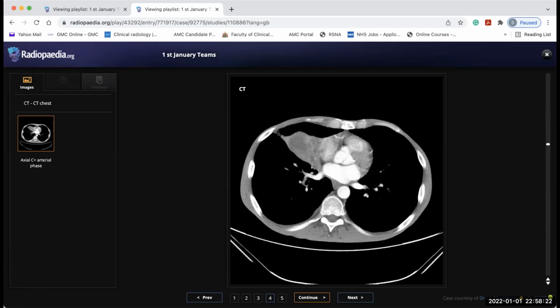So actually this is a bronchogenic carcinoma with secondary hypertrophic osteoarthropathy, in this case a kind of paraneoplastic syndrome. Okay. I think Dr. Sabhat, the time is over, so I will go for the feedback from the last. Please. Thank you so much. Yeah. So as we said, this is a case of secondary hypertrophic osteoarthropathy, as a sign of paraneoplastic syndrome, secondary to middle lobe bronchogenic carcinoma with secondary lung collapse, middle lobe collapse.